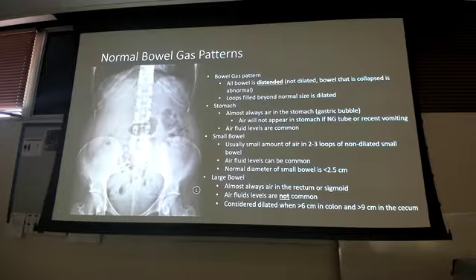How old do you think this patient is? Pretty old. What's the sign on that? Yeah, look at my calcifications too, like around the ribs. Like that cartilage is starting to calcify a little bit.